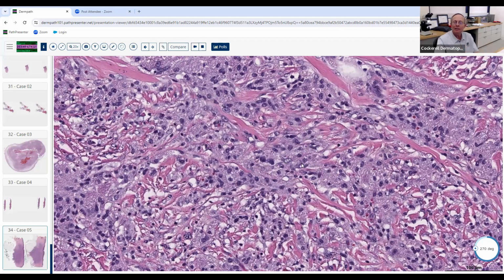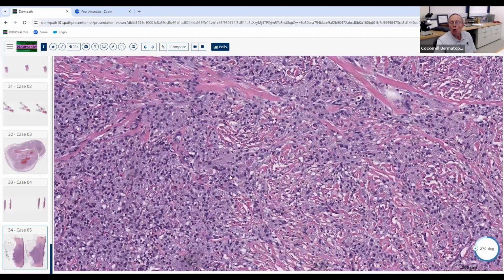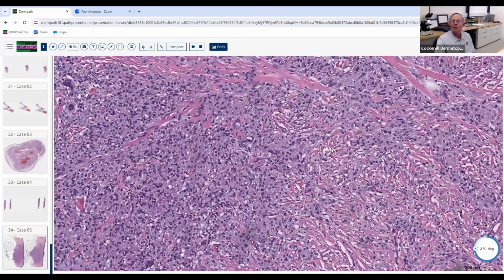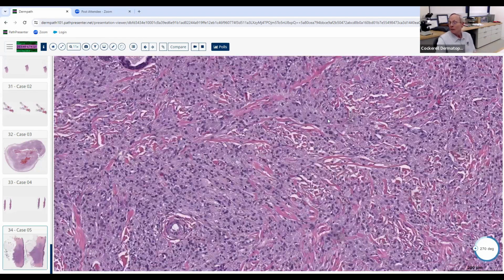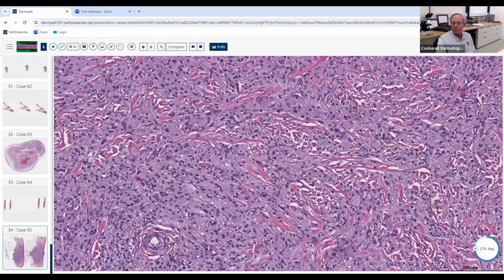So this is in the neurocristopathy. This is basically a lesion in neural differentiation. These are little cells that are trying to make Schwann cells. They never made it there, and they gobbled up these myelin breakdown products, lysosomal breakdown products with myelin in here. So this is a granular cell tumor. That's what the granules are. This is a neural neoplasm, so if you stain it with S100 protein, it lights up like a Christmas tree. If you stain it with PAS, those granules light up.